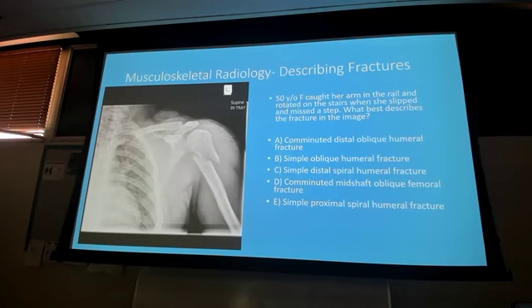Comminuted or simple? Okay, I'm taking a look at this. What do I have? Do I have comminuted or do I have simple? Simple. I only see 2 pieces. Which means I just ruled out 2 answers before I even did anything. I'm down to a 33% chance. Alright, what's the next word? Oblique, distal, proximal. Okay, woof. Distal or proximal. Let's stay away from oblique for right now because that's different. But I have distal and proximal. It's not distal, it's definitely proximal. So I just ruled out Charlie.